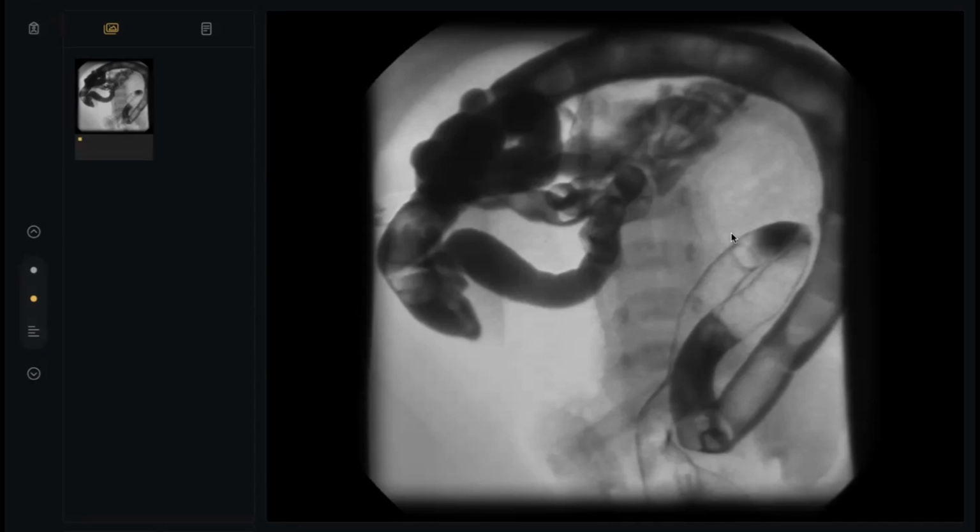By the way, my colleagues, this is not an ideal case of meconium plug. What happened here? The patient clinically is not passing meconium, everything is open, and no aganglionic segment. The diameter here is just smaller than here, but this is not a big deal. What is the most striking abnormality? These filling defects here, and I think here.